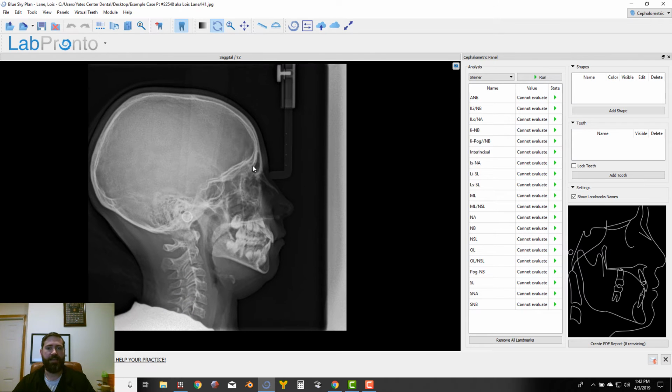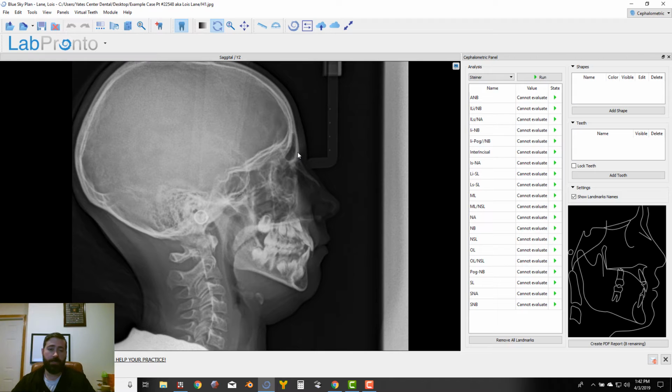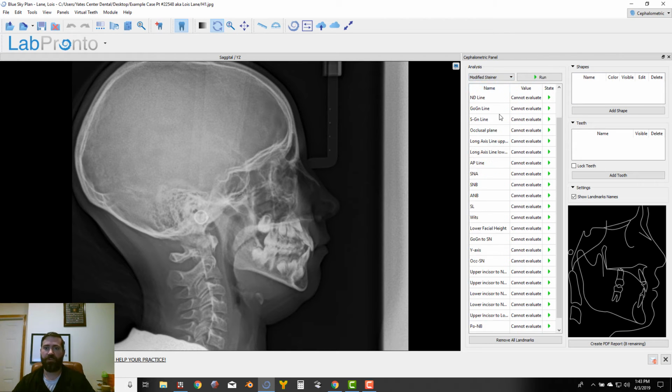So that is that. Today I'm going to be doing a modified Steiner analysis. When I first learned more comprehensive orthodontics, I did so through the Garrity Orthodontic Seminars. And so Dr. Robert Garrity, lovingly known as Big Bob, he used the Steiner as a base, but then also took some things he found useful from some other analyses as well, and amalgamated and made his own. And so I will be using a modified Steiner here. If you're used to Jefferson, McNamara, Tweed, whatever, feel free to use that. This isn't about getting into a war on Cephs, it's just what I use. And so you can see how it expounded to add a little bit more data.